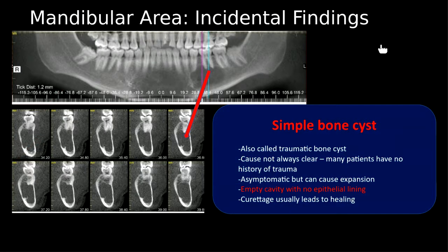And in the mandible, you can put a cross section there, and based on that, if you have selected 6, it'll show you 6, okay? And then you can see this is the lingual side, and that's the buccal side, and there is a hypodense area. And you can also see there's not that much root resorption. It looks more like a scalloping border. That looks pretty good, okay? And there's not a very expansile lesion. So one of the beautiful things about CBCT is you can see the cross-sectional views, right? We talked about that earlier.